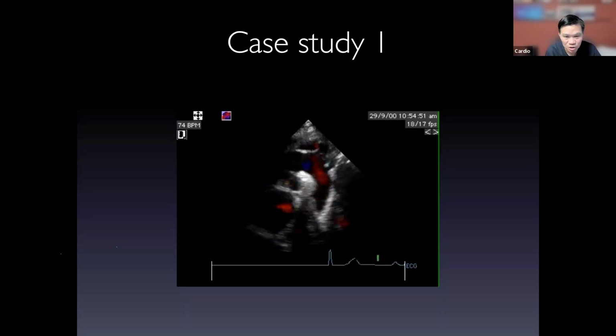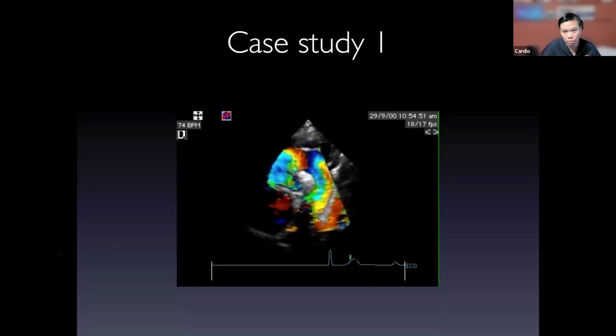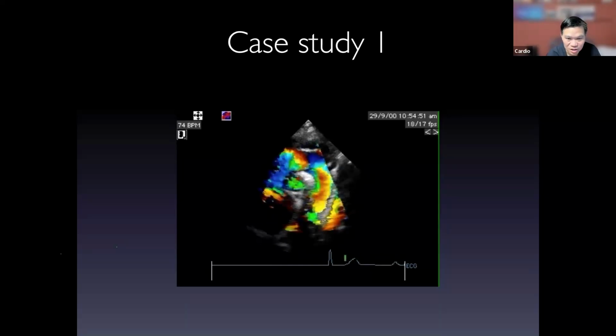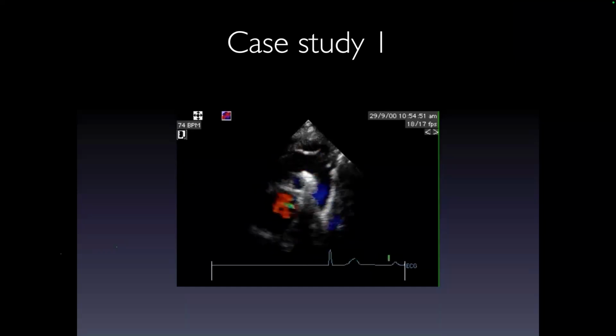So thank you, Rhonda. So it is a suprasternal view, yes. And what are we looking at structure-wise? Yes, aortic arch. Thank you, thank you. Now you're participating. Again, this is all participatory. So I need your input in doing this kind of virtual rounds. So yes, so what's wrong with this? It's a color mirror artifact.